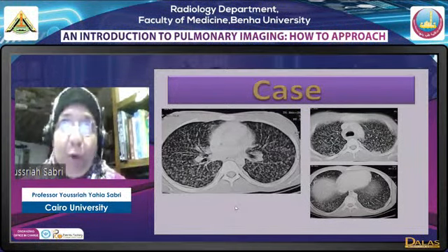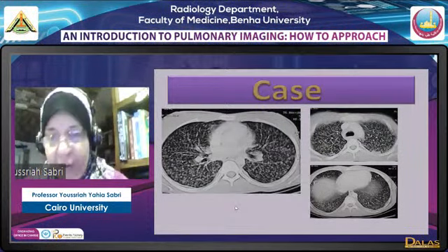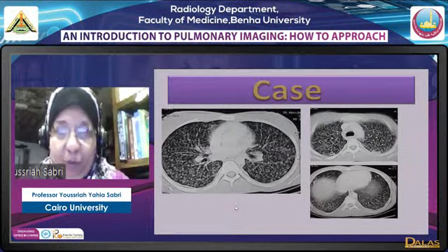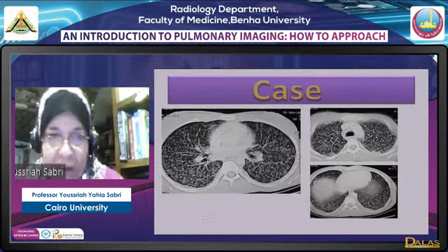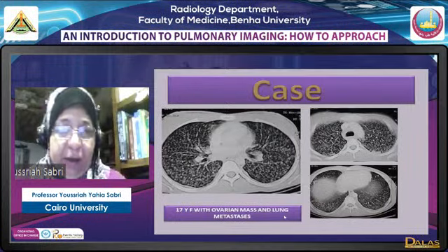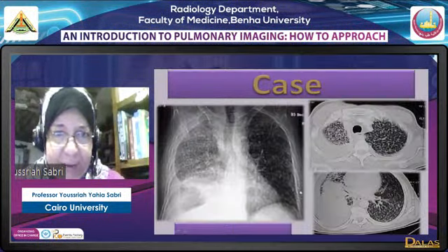We don't use the word shadow in CT because we don't have shadows in CT. You see the actual lesion. So in CT, this is miliary pattern. In plain X-ray, it's miliary shadowing or miliary pattern. This is miliary, which means I'm having numerous micronodules. This was actually a case of a 17-year-old female patient with ovarian carcinoma, and these were metastatic.